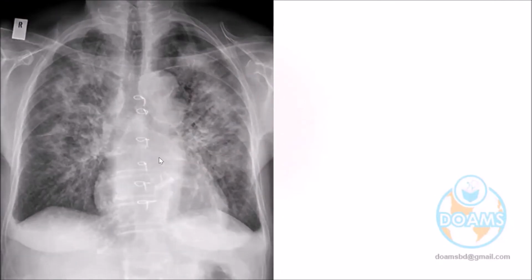Now the second trap in the X-ray. Look at the X-ray, doctor. Your patient is hypertensive. What are you seeing here? Please try to be with me in the discussion. Give your answer, please. No one? What are you looking at? Yes, Dr. Javed.